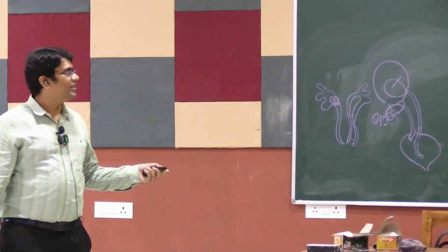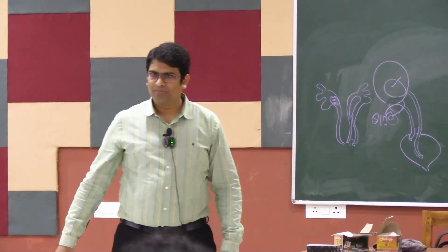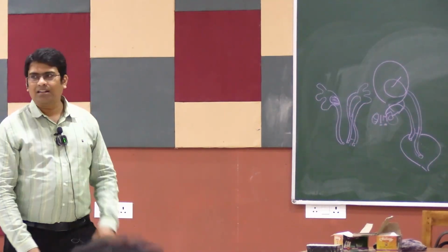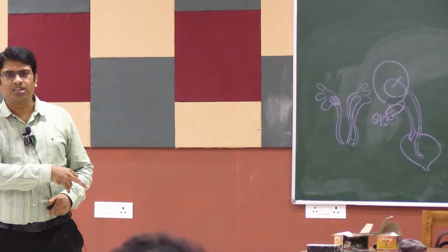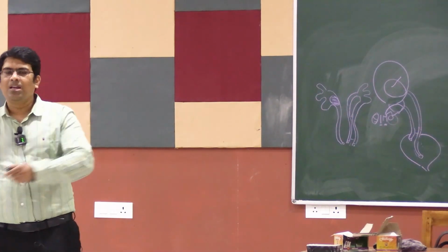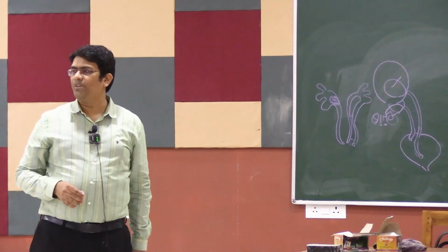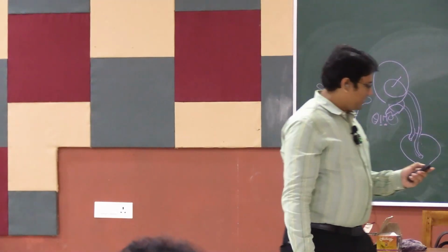How will you differentiate between a right-sided radiopaque shadow in a plain skiagram, whether it is a gallbladder stone or a renal stone? We require a lateral view film. If there is a medialization of the stone, almost nearing the vertebra, it's a renal stone, because the kidney is a paravertebral structure, lying just beside the vertebra, and a gallbladder is something very much away from this. Okay, clear?